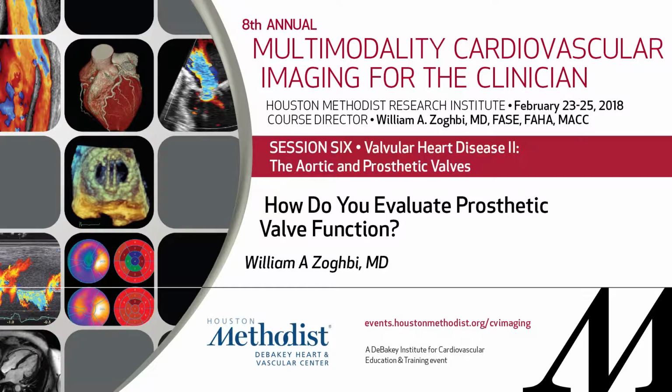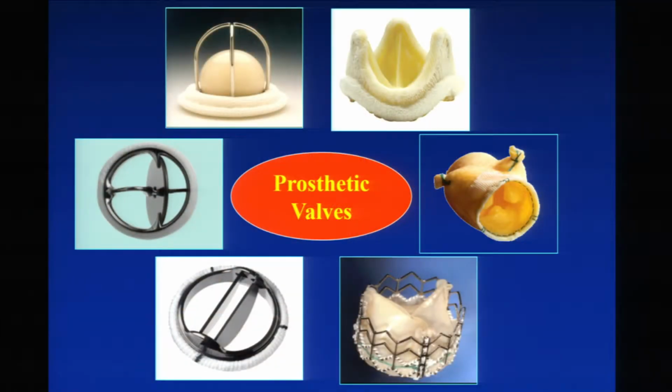All right, since we're talking about various ways of putting in different prostheses, let's talk about the challenge that we have as imagers, as clinicians, as even interventionalists. How do you assess these valve function? A priori, you know that unless you're dealing with the one at 3 o'clock, all of these are rather stenotic valves, one way or another.